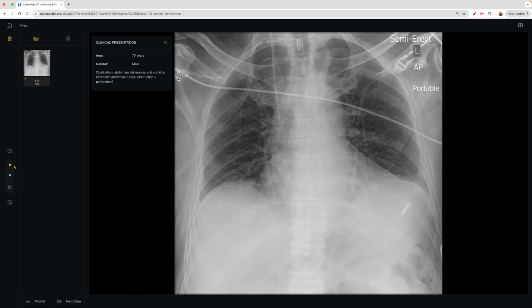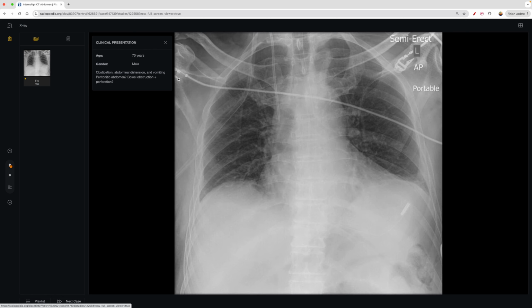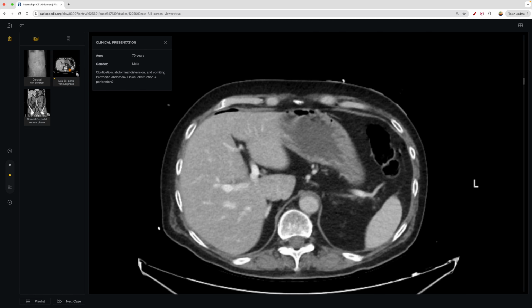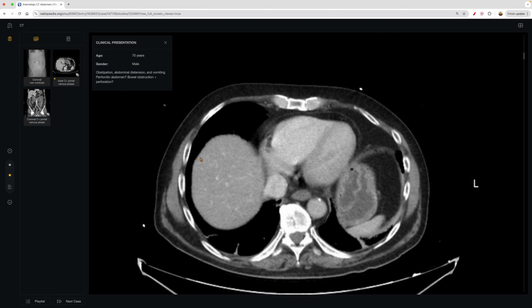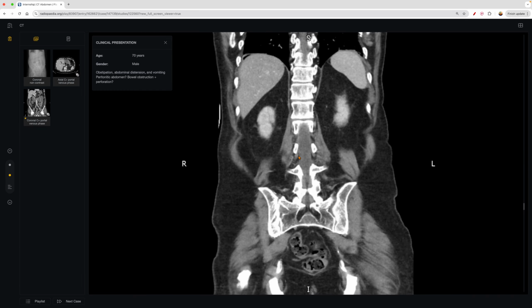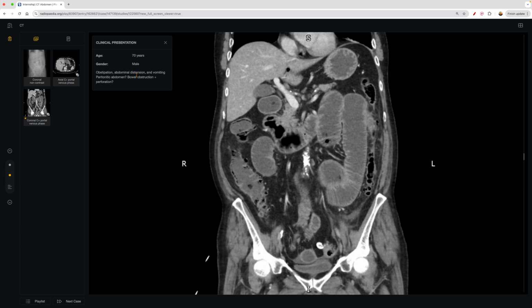Alrighty, let's just look at the X-ray here. So we have a patient here. I think I had shown this before on another image, but nonetheless, so this patient here, let's just look at the CT image. So for the CT image, let's look at the coronal view. That's always my favorite. And I'll just very briefly say that this patient ended up having free air within the abdomen, given they were concerned, of course, from the symptoms.